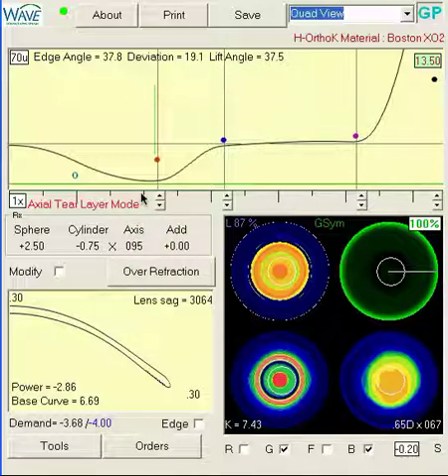But what I would personally do with this case is I would turn off the asphericity because I have a hard time just seeing what's going on with asphericity in place, because with hyperopic ortho K, everything is happening so close to the center of the lens that the numbers we get in terms of power and demand are really affected by even a small amount of asphericity, and it makes it hard for me to follow. And I found that just by adjusting the demand, we can get additional changes, or we can cut back on changes without having to do that.